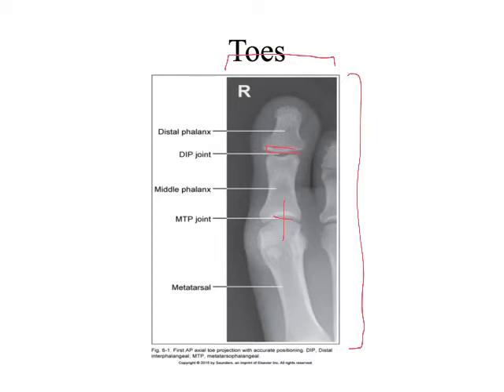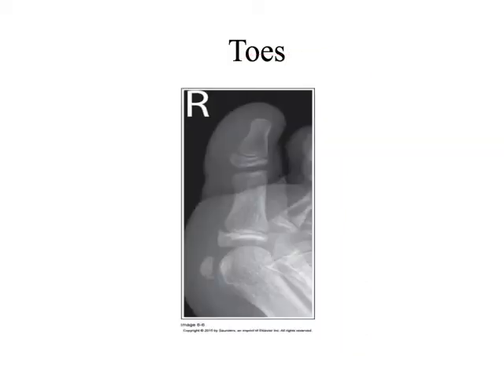Okay. Here, what is this image here? How would we describe this image? Lateral or oblique? It's a weird oblique.